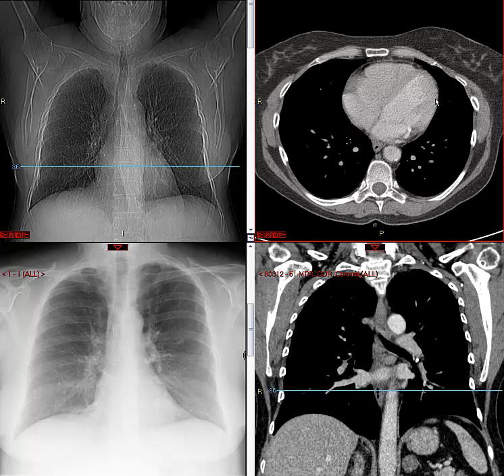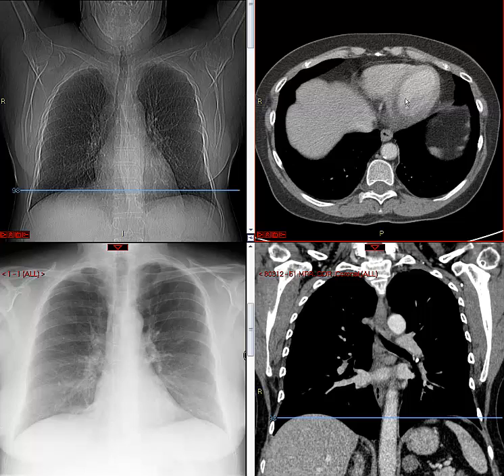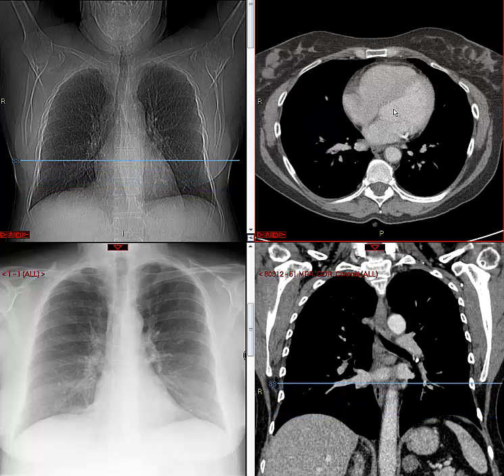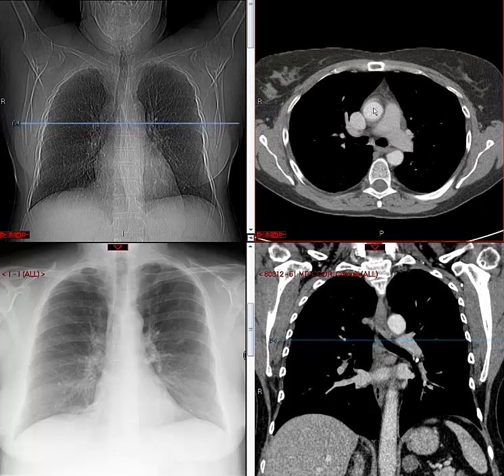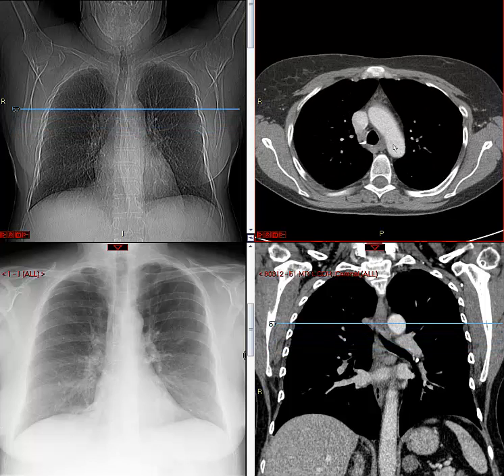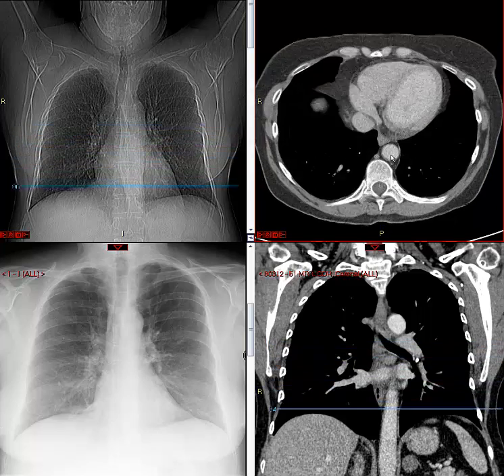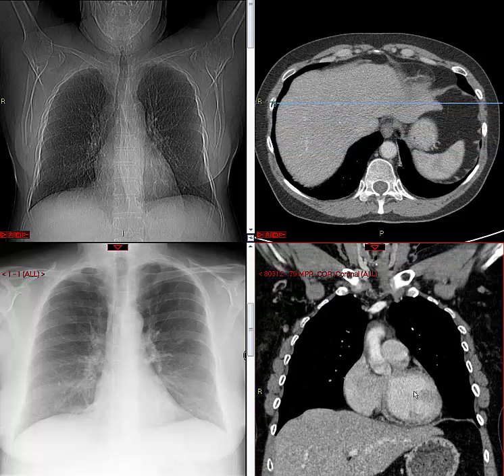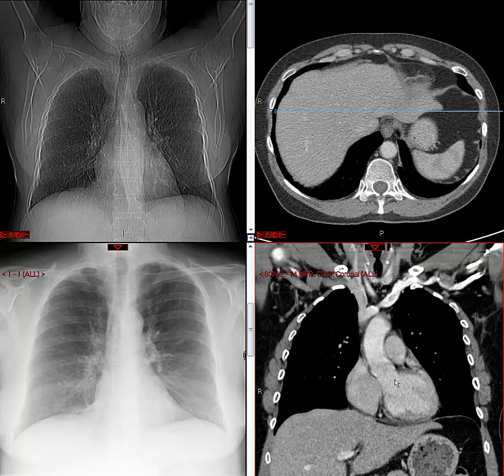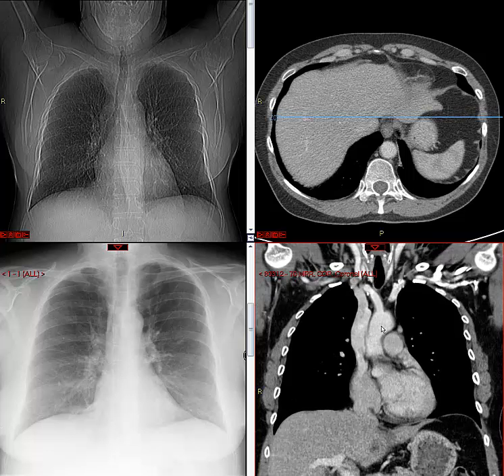Notice it has a lot thicker wall than what the right ventricle does. Here's its chamber, and as we follow it more superiorly, you'll see it go into the aorta. So here's ascending aorta here, and the aortic arch, and then descending aorta, descending the chest here. And let's look at a coronal view. This is the left ventricle here, and then this is aortic sinuses, and then ascending aorta, the arch.